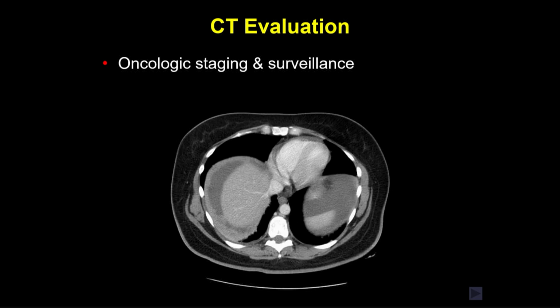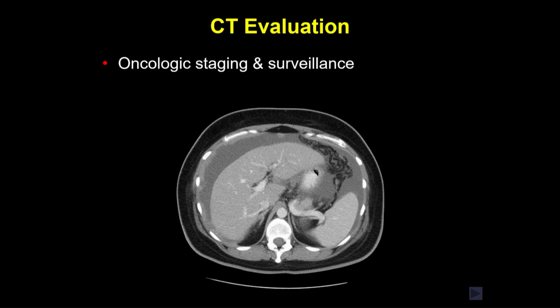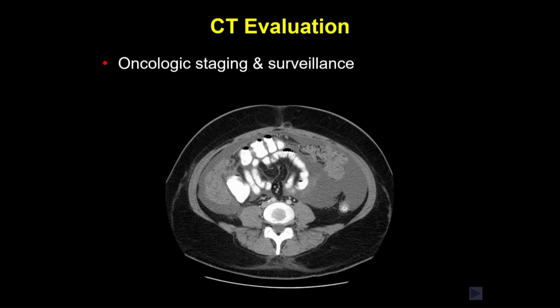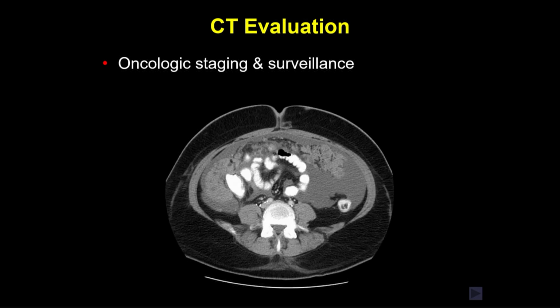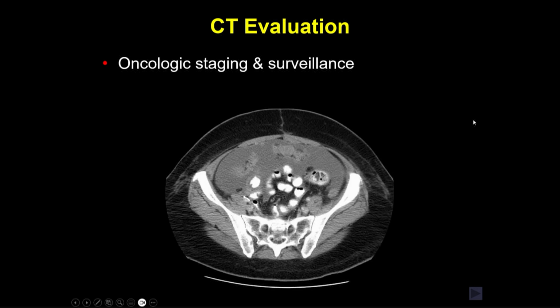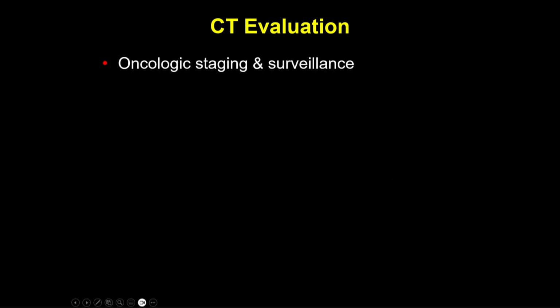This is what the patient looked like, unfortunately, about a year later. Now, this is classic peritoneal carcinomatosis with obvious massive caking, parietal and visceral involvement. And you don't need any oral contrast, obviously, to make that detection, but you don't know what you're getting into at the beginning.